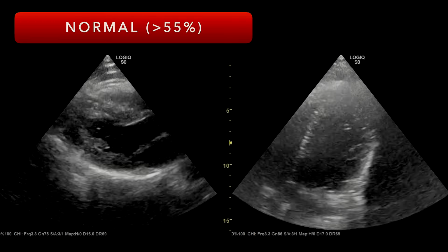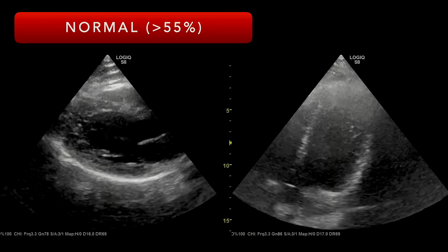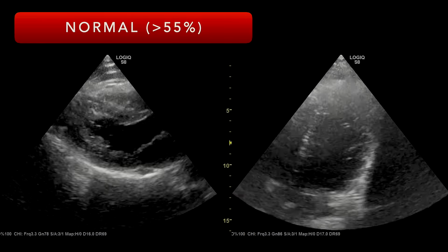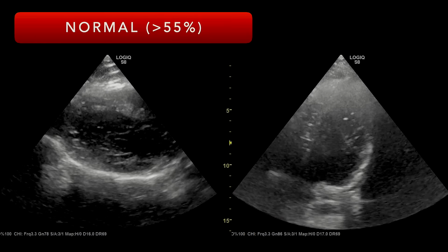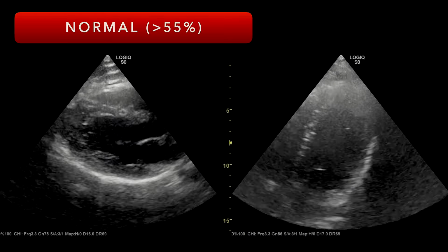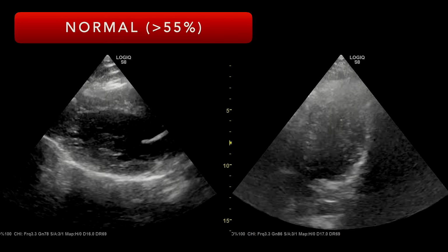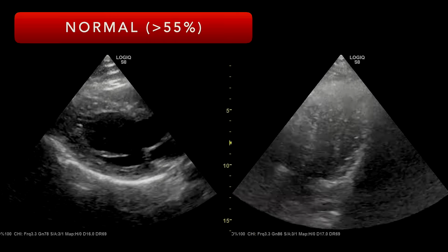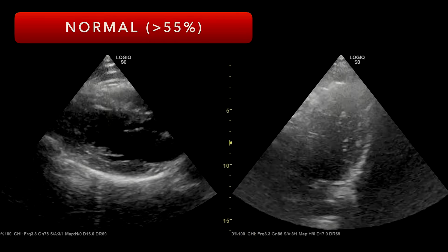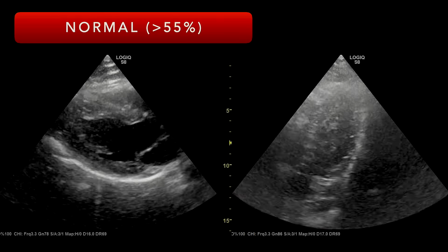And what we want to do as we're assessing this is we really want to scrutinize, where is that endocardial border? And we'll get to this as a pitfall, but I'll say it now in case I forget. If you cannot visualize the endocardial border, you're going to have a really hard time being accurate when you assess the left ventricular ejection fraction. In fact, I had an example of this yesterday that I QA'd, where it was really hard to see the endocardial border, at least in the images that were stored, right, or archived. And so when the person says, hey, this is what the ejection fraction is, it's really hard to say I agree or disagree, because you don't see that endocardial border and really the definition of the confines of that volume of the left ventricle.